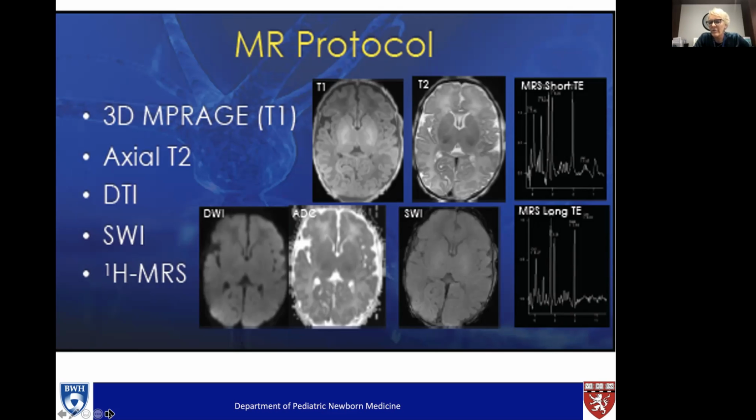But you can see a lot of brain structure here because you can see the so-called cortical ribbon, the gray matter of the cortical gray matter wrapped around the outside of the brain. You can see the somewhat less contrasted but present white matter that's present. You can see in the middle the kidney-shaped structures of the deep basal ganglia, the deep nuclear gray matter. And you can see those areas that stand out as contrast are actually myelination. Those are very important, as we'll see. So you can see a lot of structure, even on one slice.